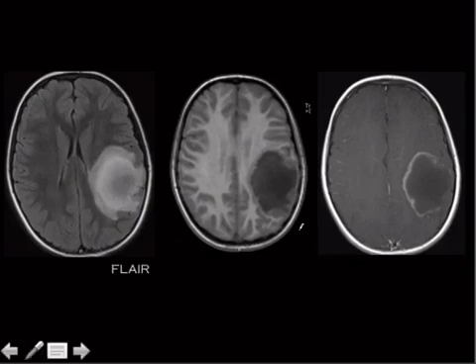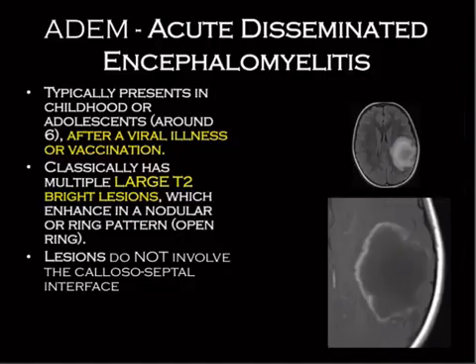Let's do this next one here. White matter, we said that's white, so this is T1, and then T1 postcon anytime you're seeing contrast. So rule number one, if you've got enhancement, look at the pattern. What's the pattern of enhancement here? It's a ring, or it's incomplete ring, right? So we know that we're dealing with a demyelinating thing. A lot of edema, and it's big. So ADEM, it's monophasic for the purpose of multiple choice.